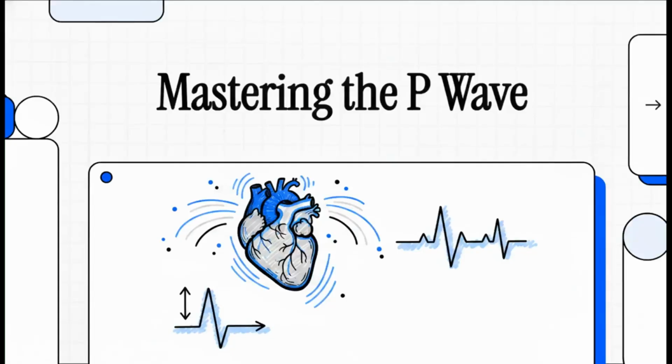Welcome to this explainer. Today, we are moving way beyond just memorizing those squiggly lines on an ECG. We are going to truly master the P wave. So instead of just basic pattern matching, we are diving deep into the actual physical mechanics of atrial depolarization. It is kind of like looking straight under the hood of the heart's electrical system.